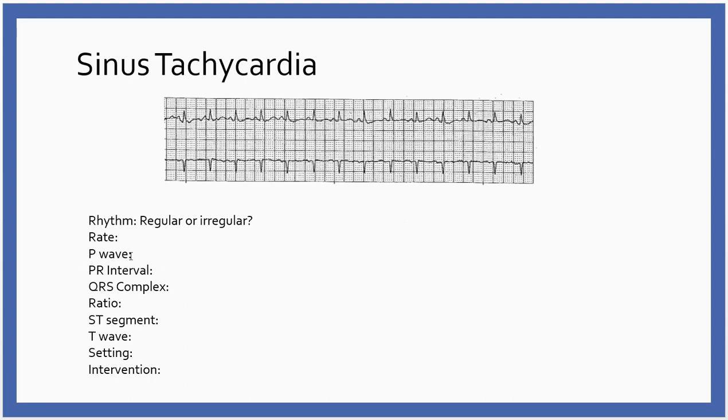All right, now I'm looking for my P waves, and so I'm not going to point to them. I'm going to give you a second to get up there and look at the strip and circle the P waves. Easiest lead to find the P waves on this strip is lead 2 again. And you'll notice there's a little bit of squishiness here, some extra stuff.